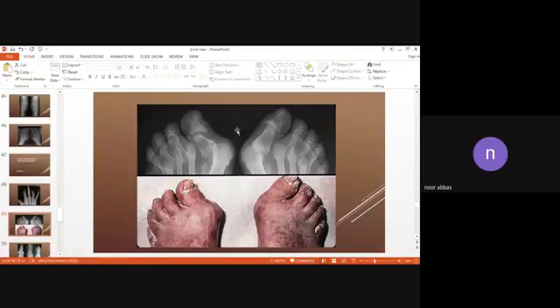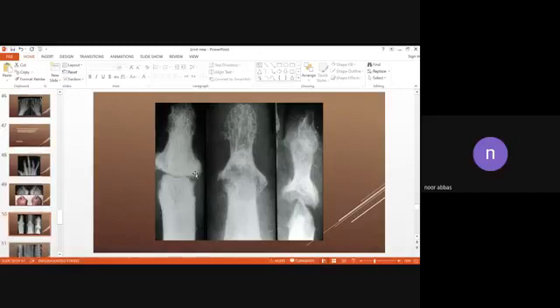Of course, the patient will have a background of psoriasis and the typical skin lesions of psoriasis, but sometimes, rarely, the arthritis may precede the skin changes. We notice the predilection for the distal joints, with loss of bone, subluxation, and dislocation in end stage psoriatic arthritis. One of the characteristic features of psoriatic arthritis is preserved bone density, and sometimes even somewhat increased bone density, and new bone formation, periosteal reaction, will happen on the edges of the involved bone.